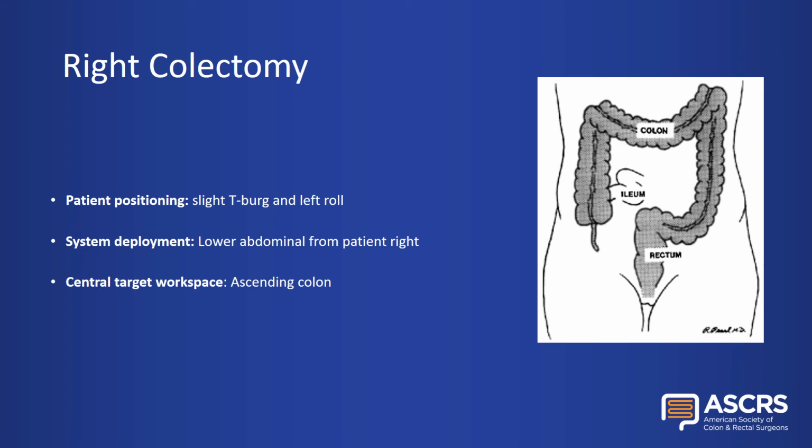For example, if the tumor is in the cecal area to be excised, the surgical work volume would reach from the right lower quadrant cecal area to the hepatic flexure. The center of the surgical volume would be approximately the area of the ascending colon, and that should be selected as the target site, as can be appreciated on the right side picture.